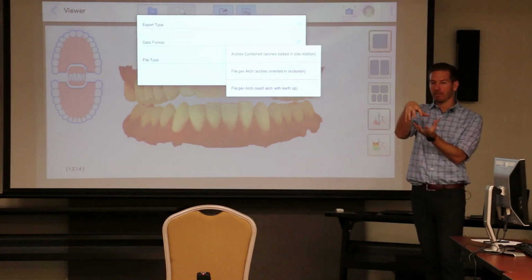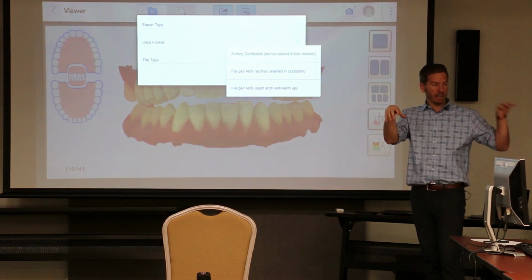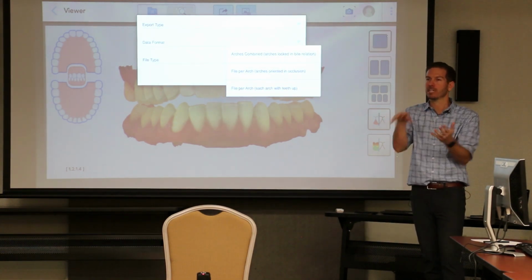So if you bring them into Blue Sky and you move one over here, and then you say, oh, I want to move it back to here, you can say, hey, move this file next to this file in their original location reference. And you can do those functions.